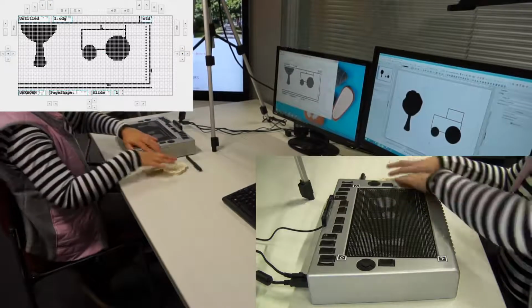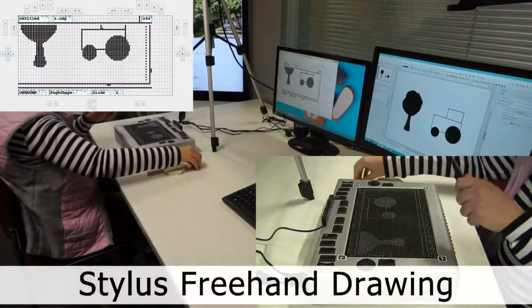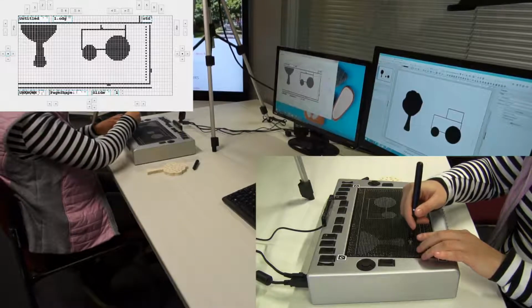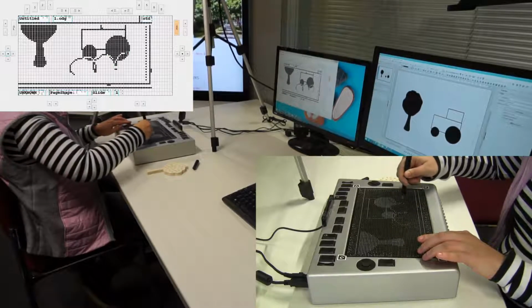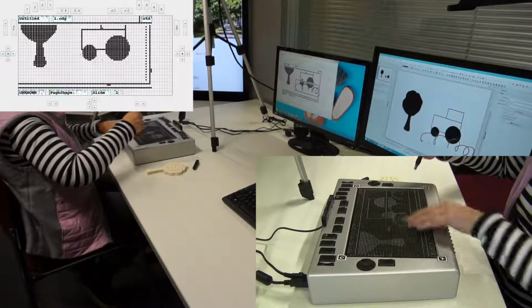Complex and freely defined shapes are sometimes hard to create with the previously presented methods. For drawing freehand figures, we installed a wireless stylus pen on the workstation. The stylus has a soft, brush-like pen tip to not damage the tactile display and to not get harmed by the irregular display surface. The stylus digitizes the user's drawing while pressing the stylus tip on the display surface. Bezier curve_12 selected.